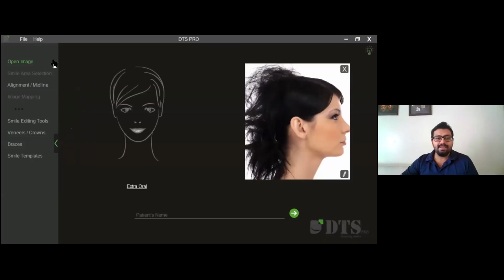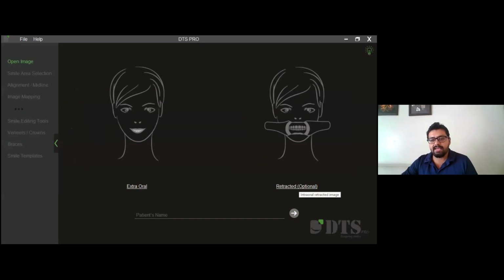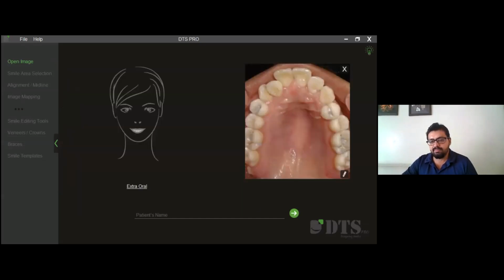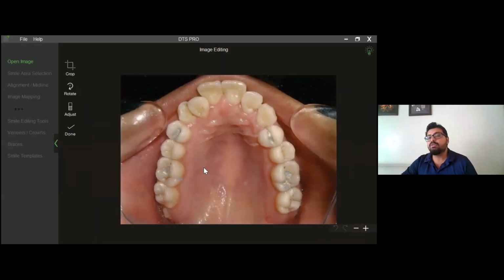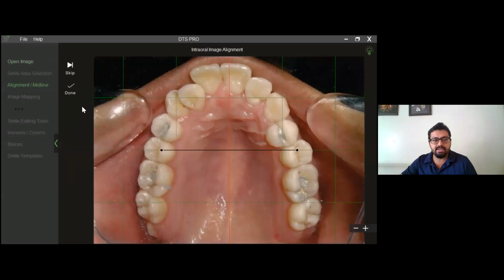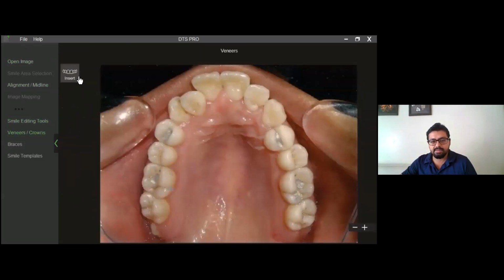And you can also carry out measurements with the calibration tools. So if I have a picture of a patient, an occlusal view, for example, where you want to do the space analysis or carry out certain measurements, you can just do it.